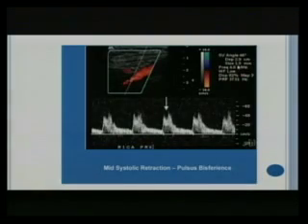All right, now we'll come to some interesting waveform patterns, which we see not too infrequently. These are basically cardiac anomalies or central anomalies of the heart that can cause aberrant waveforms here. None of these examples are my own. I have got them from the web. Now, mid-systolic retraction is seen as what is known as the pulsus bisferiens. This is the internal carotid artery, and you start seeing a notched pattern at the peak of systole. It's a blunted peak, it's a broad peak, and you start seeing this notch. This is called the mid-systolic retraction and is seen in pulsus bisferiens.